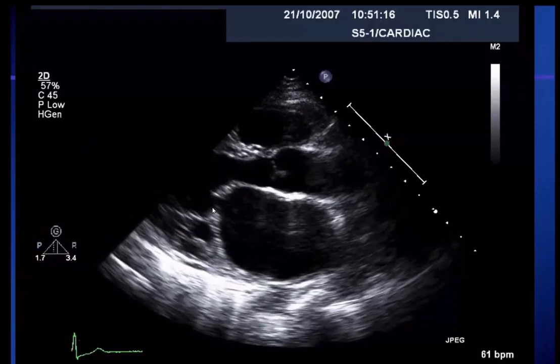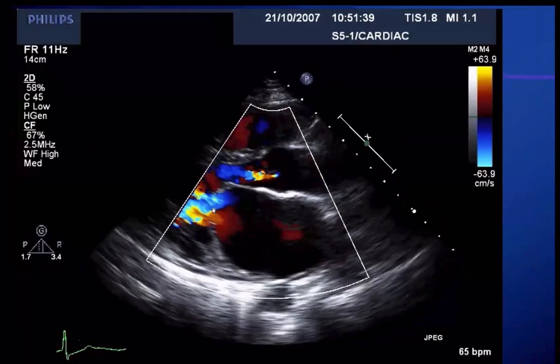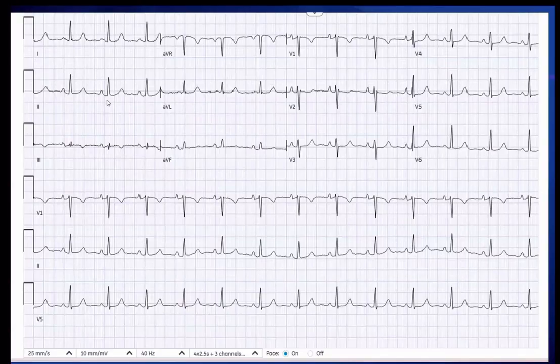Now I am going to show you her ECG after mitral valve replacement. And you can easily appreciate that the P wave has come down. So this is the P wave. And here in V1, it was inverted in the previous slide. Here it is upright. So both atria have come down in their size after mitral valve replacement surgery. And this is an example of how we can also see the P wave. So we go on.